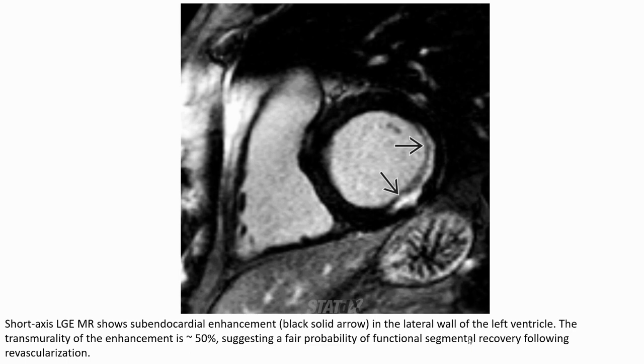The short axis late gadolinium enhanced image also shows subendocardial enhancement, black solid arrow, in the lateral wall of the left ventricle. The transmurality of the enhancement is about 50%, suggesting a fair probability of functional segment recovery following revascularization.